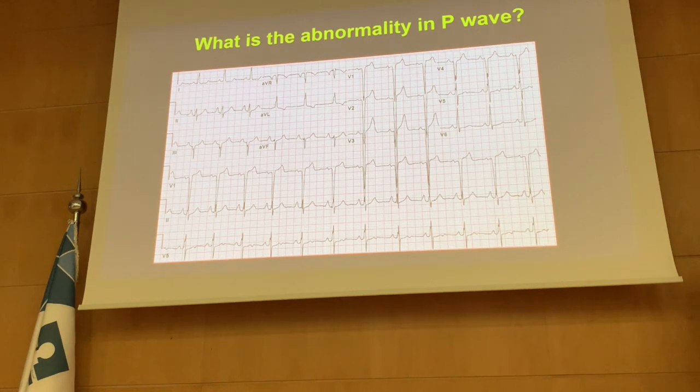So how can you confirm for the other groups this is the P wave, not something else, maybe the patient has another QRS? If you're going to make sure, just go up. So this is for sure a P wave, and it is followed by QRS. And this is really, really big now, okay? So this is for lead 2. And we're going to see lead V1. In V1, the P wave is acceptable. It has also a negative portion here, but it's not big. So this is reflective, it is typical for right atrial enlargement.